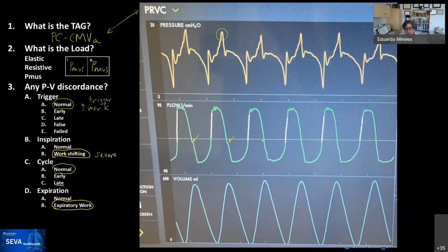Which is a labor of love, being at the bedside, moving that time. And you could ask why would we even be on this mode under these circumstances, but we'll talk about that in a second. The second item, and so then finally there's the adaptive part, Udi, that you read.